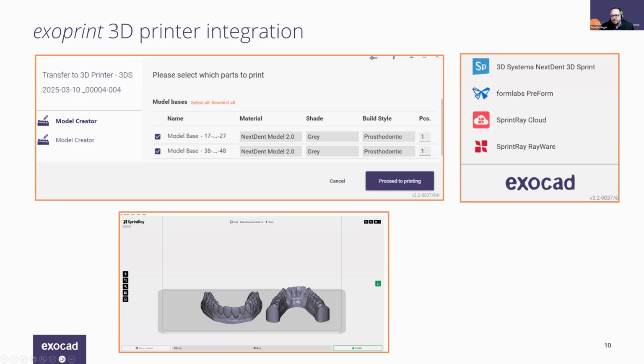With our software, we have several integrated 3D printers, so if you have that 3D printer company's slicing software installed in the default location of that software's installer, our Dental DB is going to automatically detect that that software is on the PC and give a clickable button where you can launch their slicing software and choose what parts of your design are going to automatically be added to the build plate.